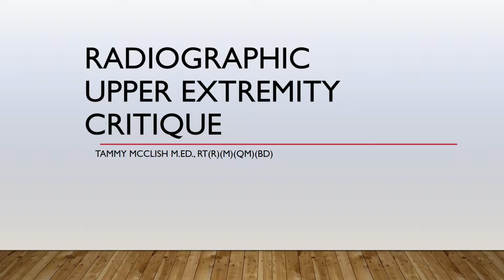Let's go ahead and take a look at upper extremity radiographic critique.